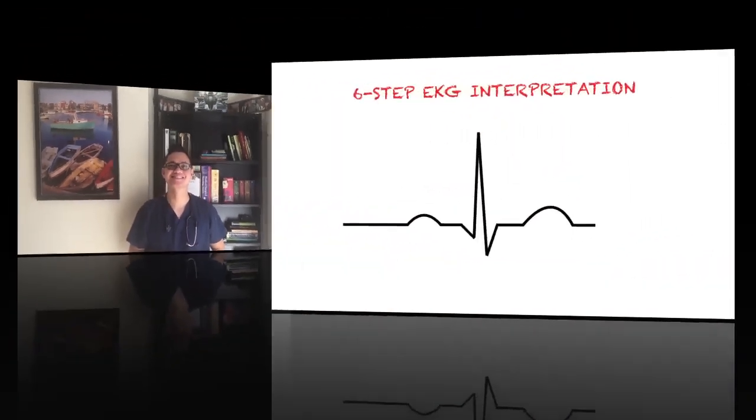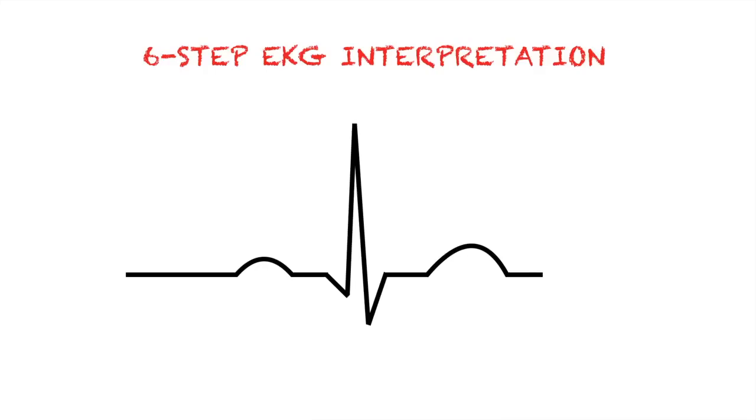So today we're going to talk about the easiest way to do your EKG interpretation. So if you're a nursing student or a new nurse who wants to do your EKG faster, stick around. This video is for you. Alright guys, this is the 6-step EKG interpretation.